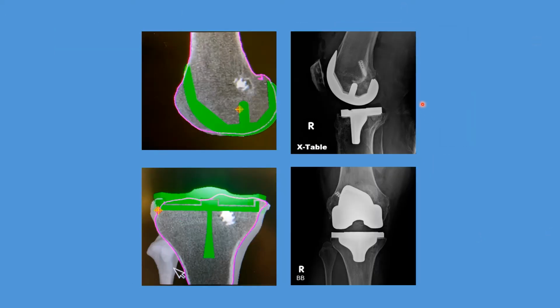So this is what our completed knee replacement looks like. And the nice thing is we know exactly what our knee replacement will look like afterwards because we planned it ahead of time. And so our radiograph matches exactly our preoperative planning. But very importantly, we also see that this screw was never in the way of the implant. And we knew that ahead of time by looking at the CT. On the other hand, when we looked at the tibia, we saw that this interference screw was blocking our tibial implant. So this had to be removed.